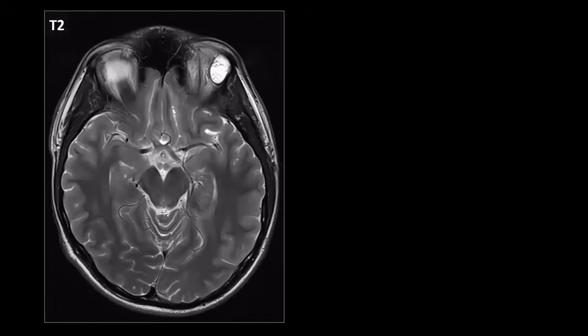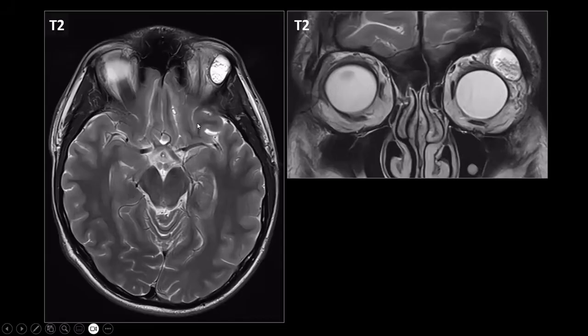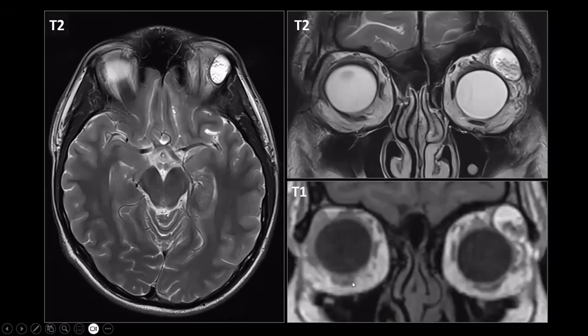This is a lesion which at first glance appears to be located in the lacrimal gland, but was actually located in the vicinity and compressing the lacrimal gland. It was not primarily located in the gland, and it is very hyperintense on T2 weighted images. I'm talking about this lesion over here. And on these coronal T2 weighted images, we see the lesion on this side being very hyperintense, but somewhat heterogeneous. And on T1 weighted images, we see that the lesion is also very hyperintense. Gadolinium was administered to the patient. There was no clear enhancement, but of course that is difficult in a lesion that is spontaneously T1 hyperintense.